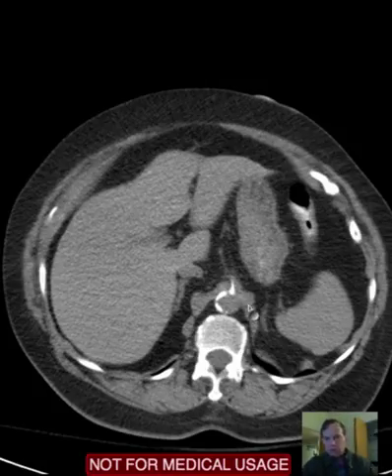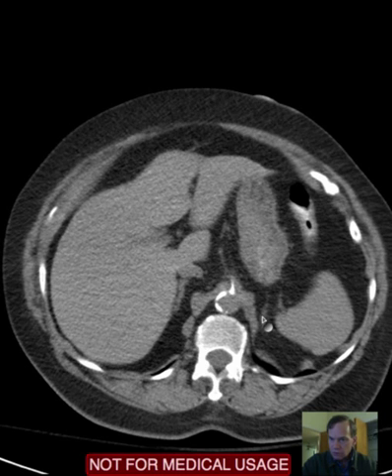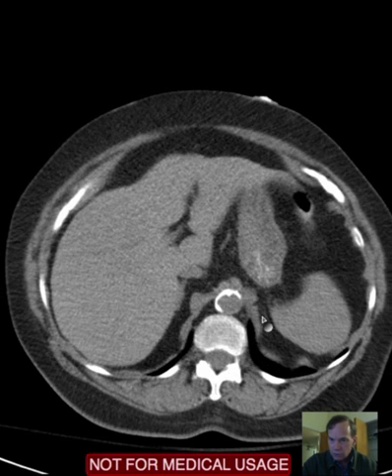They are called crura. That's the plural of crus. This is the left diaphragmatic crus. This is the right diaphragmatic crus. And these are the diaphragmatic crura.